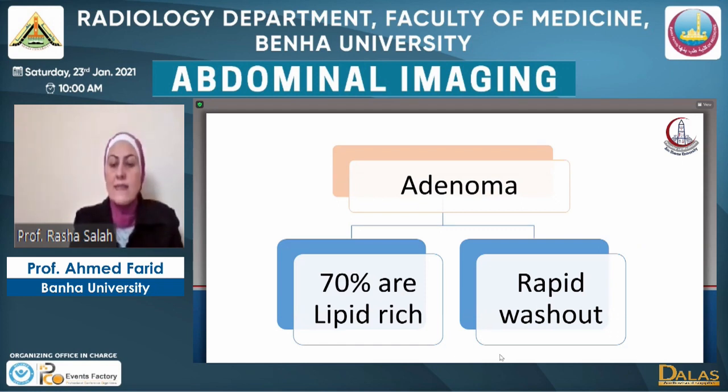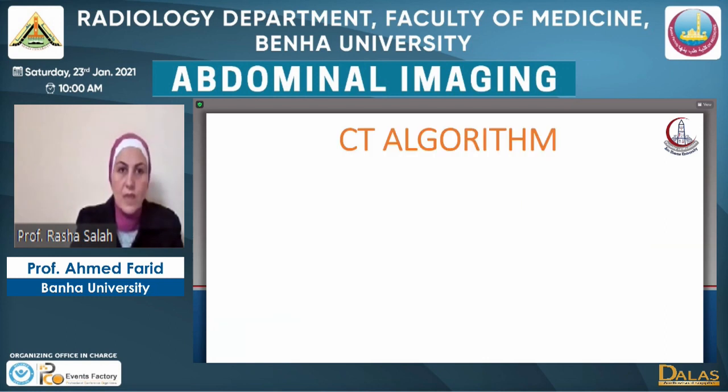Lipid-rich adenoma is characterized by predominant fat content, and as we mentioned earlier, it has a low ADC and low Hounsfield unit on the non-contrast CT. If we perform the contrast-enhanced CT, it will have absolute washout of more than 60%, and this is characteristic and diagnostic for adrenal adenoma.